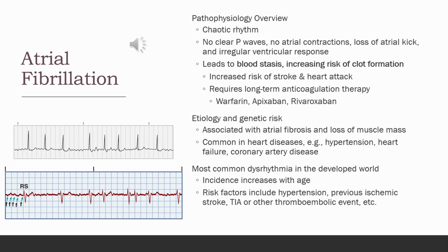fibrillation. So next, remember we look at the P waves. With this, there's no distinct identifiable P wave. Instead, we see this chaotic fibrillatory wave. And that is how we identify atrial fibrillation, by those chaotic fibrillatory waves between the QRS complexes. The QRS complexes are usually going to be normal in their shape and duration, which just indicates that conduction through the ventricles is still intact.